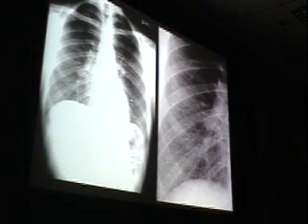But I would guarantee, having shown it to a lot of residents, I can tell you that most often when they see it, the thing they think about is miliary TB, which is a reasonable thing to think about. But what is missing is they can't go on because they've sort of said miliary and then they stop. So small nodular opacities, remember metastatic disease, and keep in mind particularly thyroid and malignant melanoma.